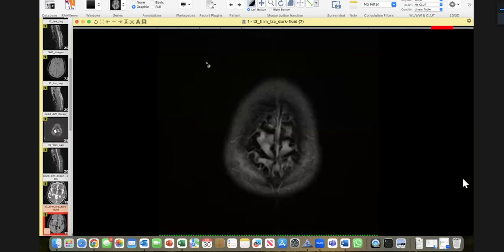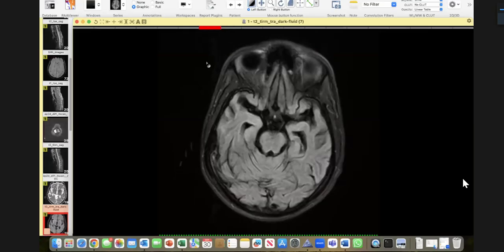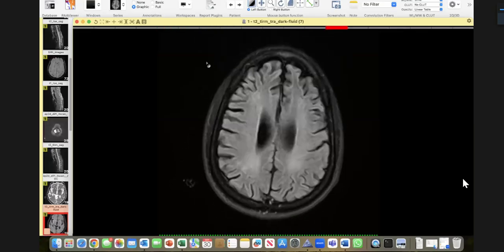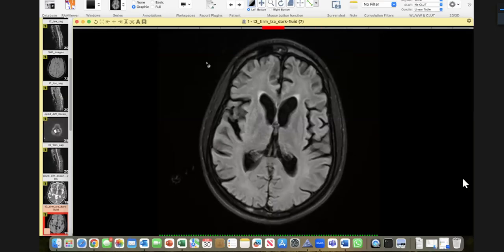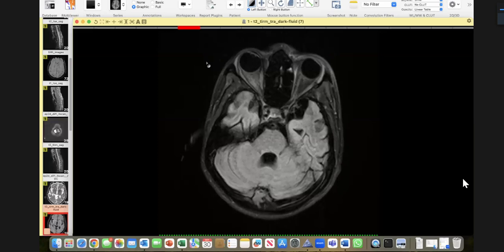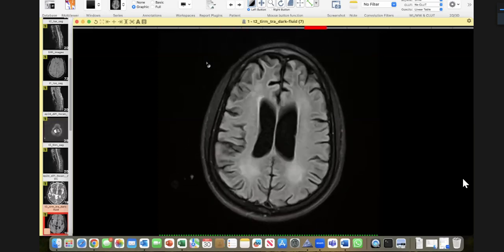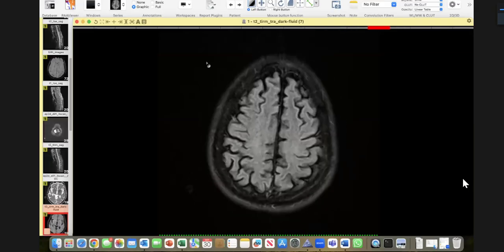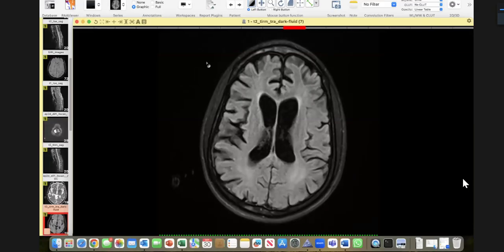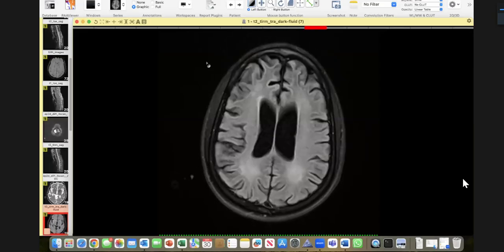So I am given T... sorry, this is FLAIR. So I am presented with a FLAIR sequence, axial MRI, of a 20-year-old male. The striking abnormality for me actually is that the CSF spaces are relatively dilated given the age. I mean, it's like he has brain atrophy, disproportionate to his age, with periventricular hyperintensity. This is a striking abnormality.